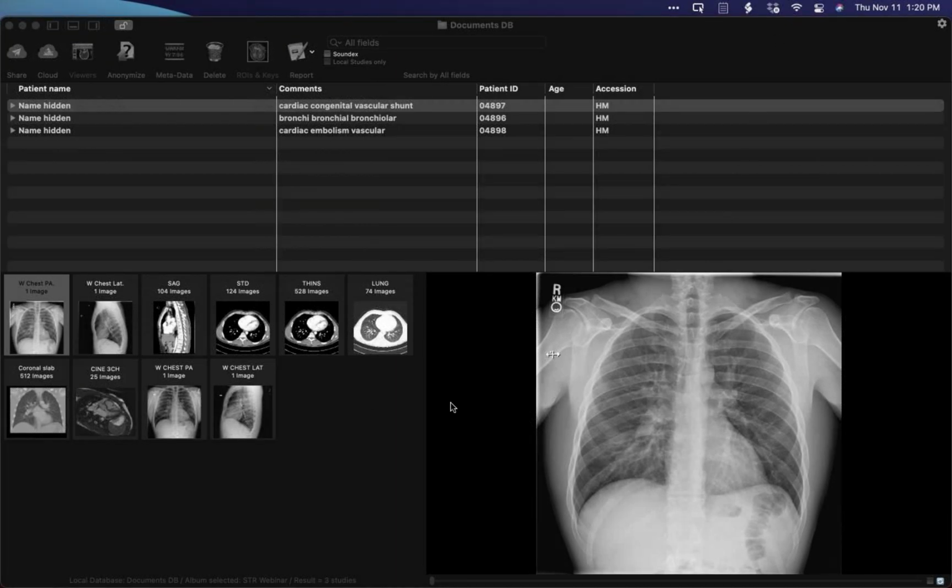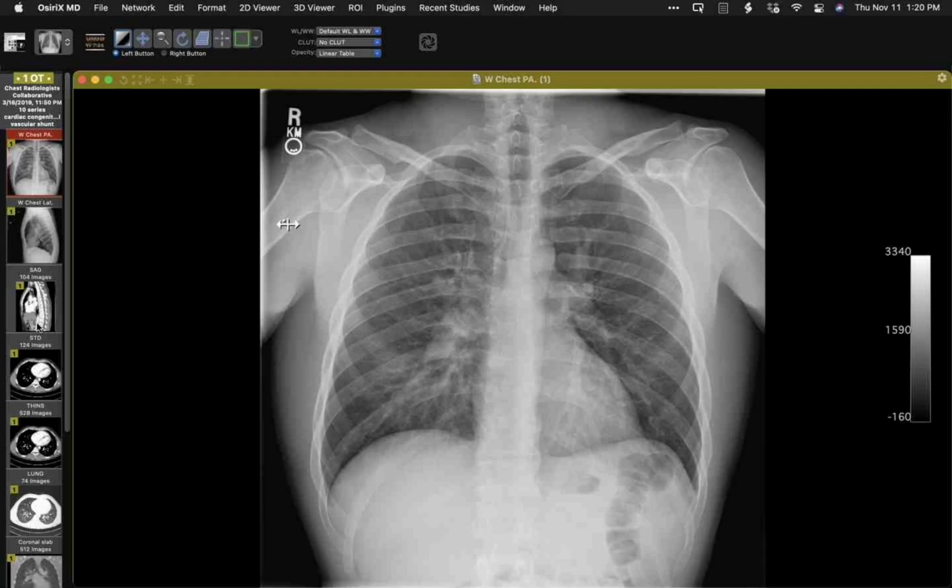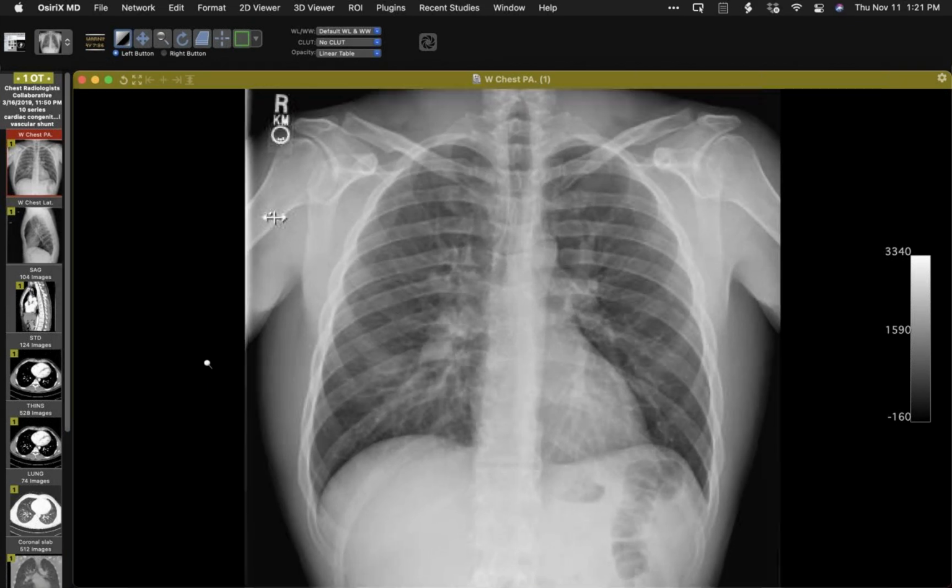Okay, today I want to show two cases in which, particularly for trainees, this should be instructive. And they both have to do with vessels in part. So here is a person, this radiograph back in 2019 was described as normal.